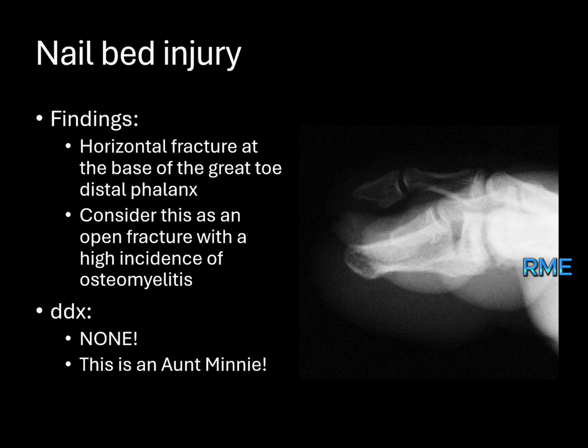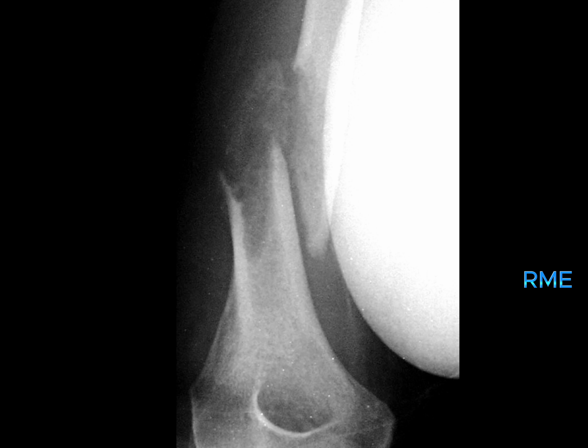To further evaluate, an X-ray of the toe can help assess the extent of the fracture. Management involves treating it as an open fracture with a high incidence of osteomyelitis, requiring antibiotics and possibly surgical debridement. Let's move to the next case.